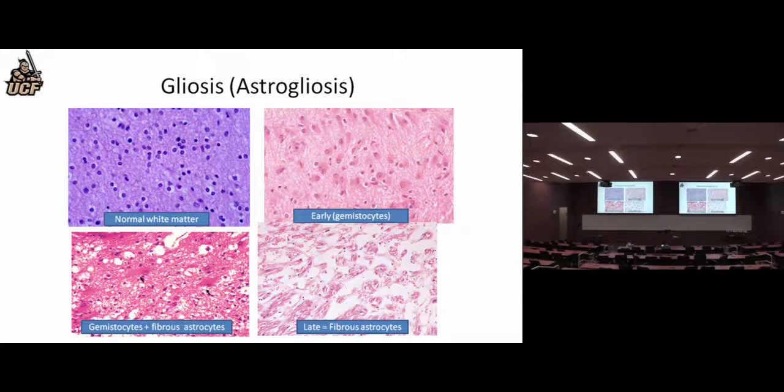They're just some examples of gliosis, normal white matter. Here, these are different stains, so it makes it sort of hard to compare. Early gliosis, what shows that it's early gliosis? Maybe some of these little cells or glial infiltration. Whereas mostly these are oligodendrocytes. Here's all these little nuclei here. I think that's some infiltration with microglia. And now we're getting some fibrous astrocytes.